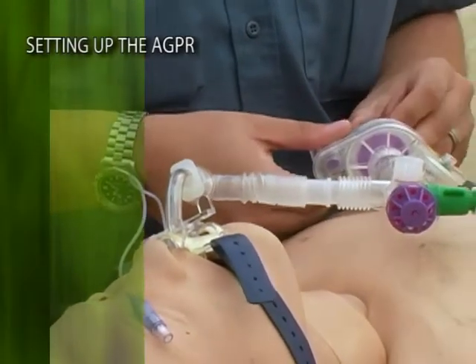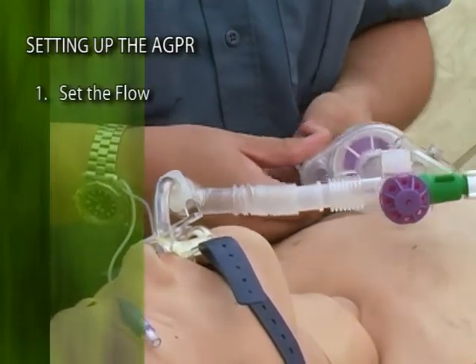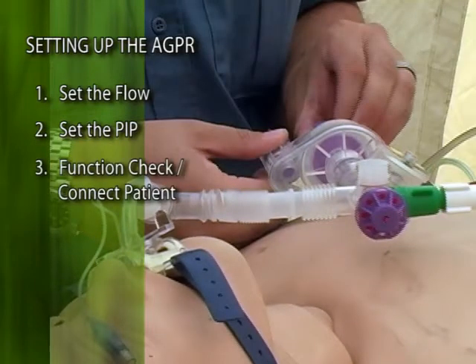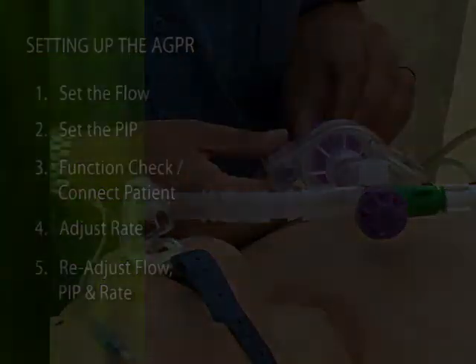There are 5 easy steps for setting up the resuscitator. 1. Connect tubing and set the flow rate. 2. Set the pressure. 3. Check the function and connect the patient. 4. Set the rate. And finally, 5. Readjust the setting to meet the patient's needs.